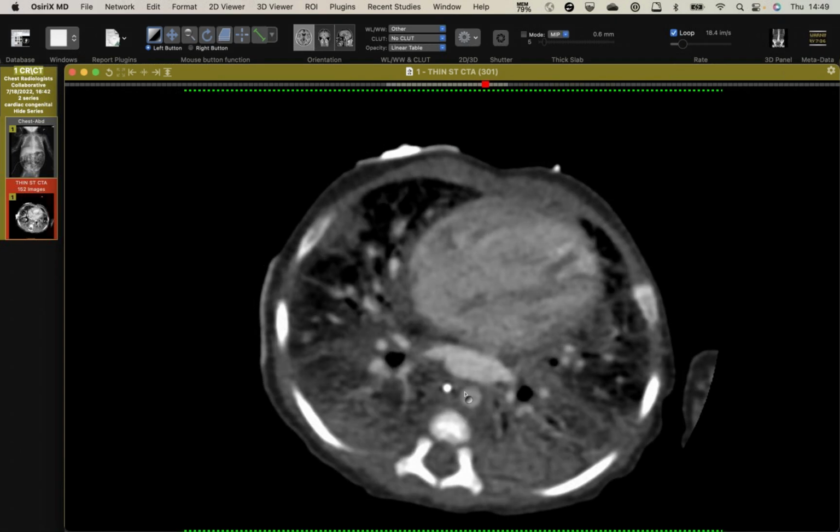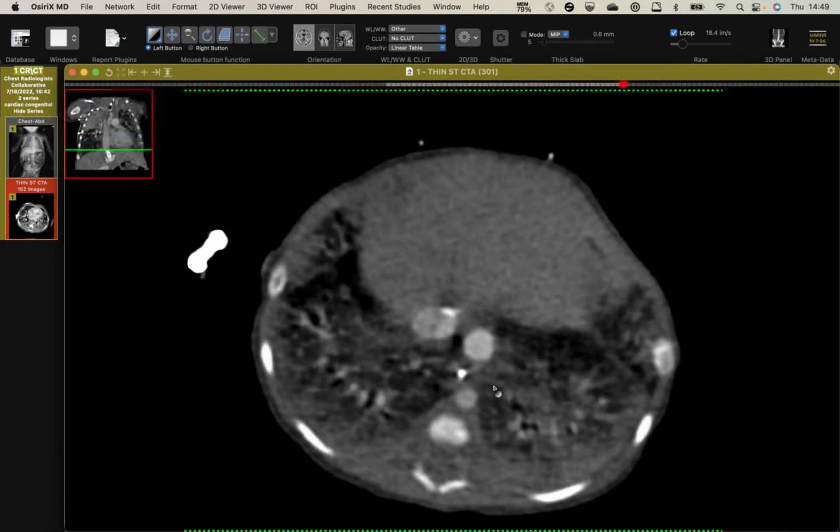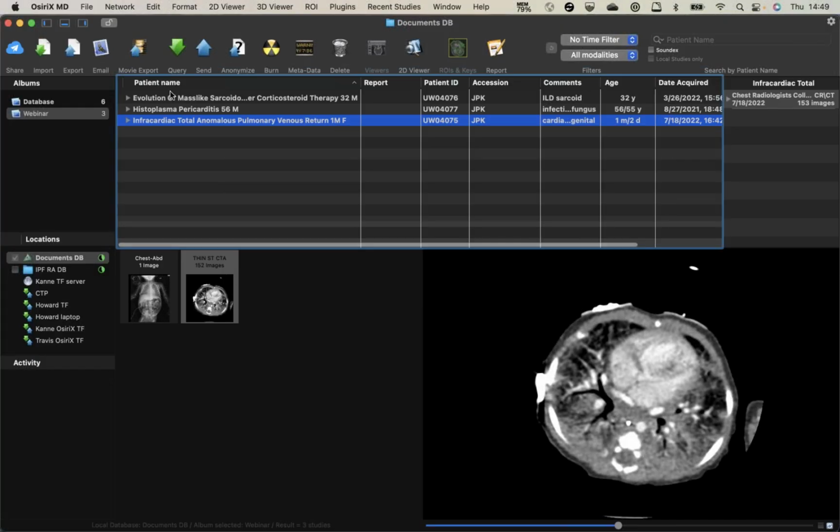Couldn't they just anastomose that point of confluence to the left atrium? I suspect that's what they would do, sort of like when they do a heart transplant. Seth probably knows a lot more. And then I guess they will eventually ligate the distal portion of it. Oh, this makes me miss scanning these little kids.